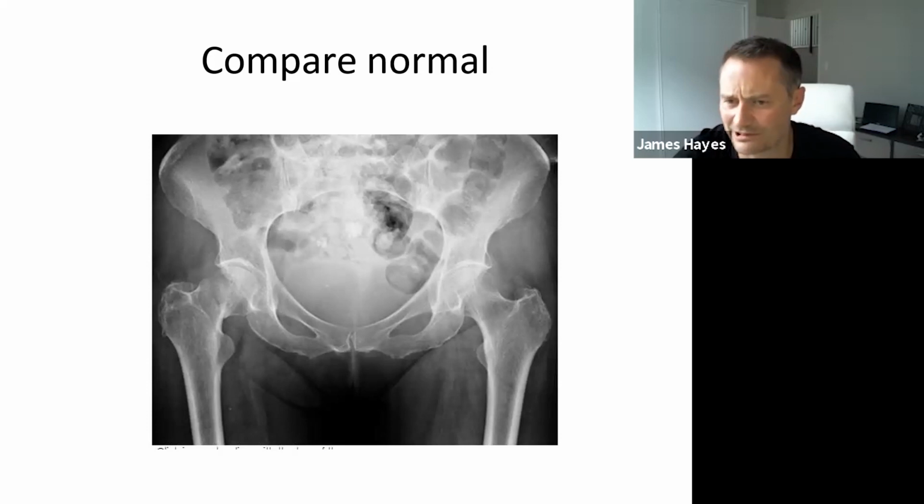But in this instance, for example, in the pelvis, this woman has come in with a sore right leg.